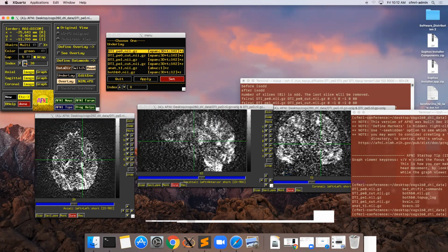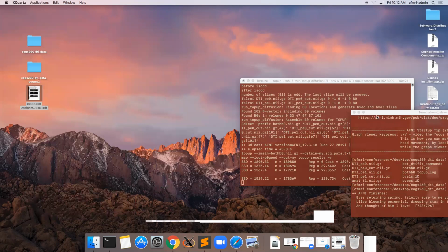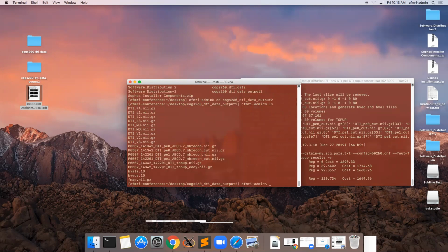As you kind of walk through the directions, you can sort of see that there are these propensities for white lines in different directions. In this case, maybe going in that direction in the center image. Let me pull up the other data so it's a little clearer. DTI data is just filled with artifacts, so it's something that has to be kind of carefully controlled for.